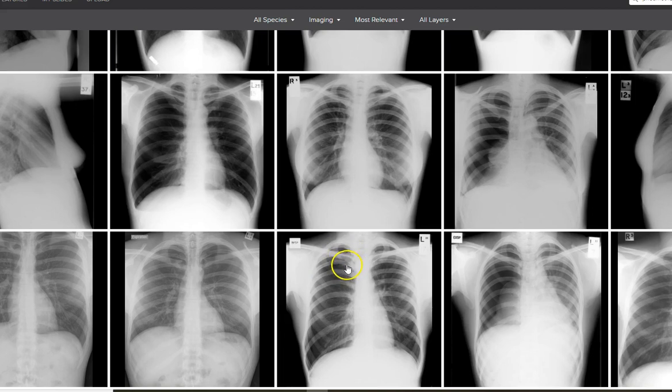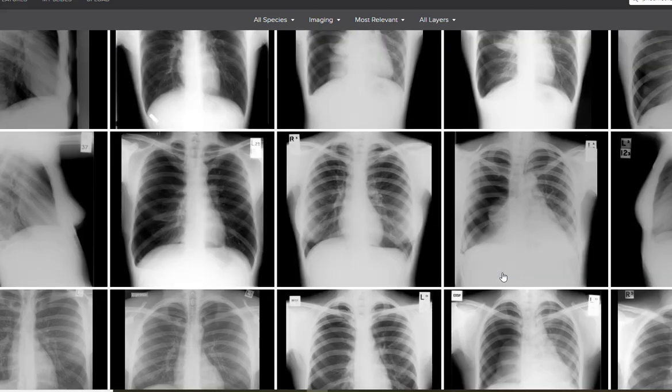Here, there's pneumothorax, there's the edge of the lung. Here's a massive pneumothorax, tiny little kidney of a lung, it looks like, almost. So pneumothoraxes can be big and small. If they're just filling the top, tiny bit of the top, then the doctors may choose not to drain them, and they might just let them recover if the patient's not too symptomatic.